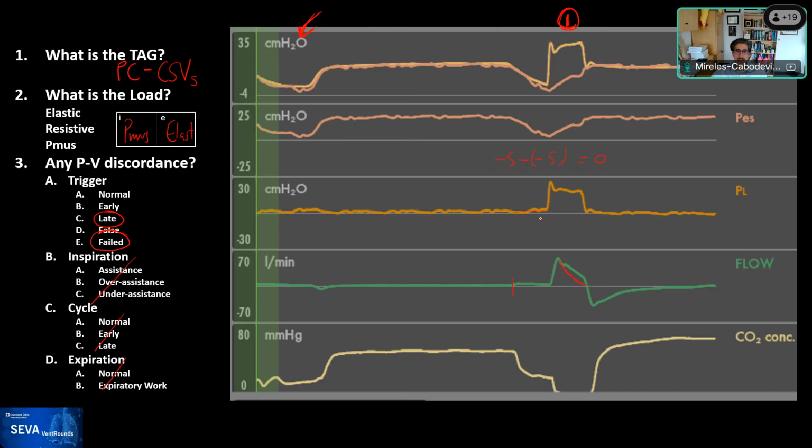It becomes a 0. And then when the ventilator pressurizes, you can see the delta between these two. The airway pressure is higher than the esophageal pressure, and that's why you see the pressure rise at this period of time. So this is important. The patient is doing effort, but with no change, and so the transpulmonary pressure remains the same, the pressure across the structure.